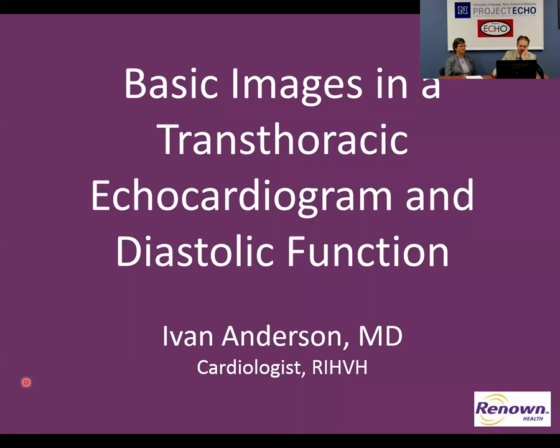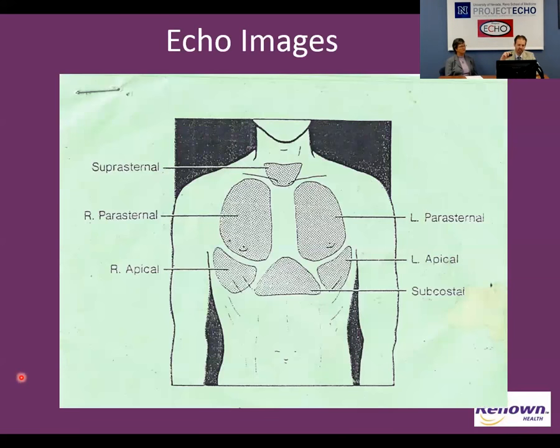This is just some basics about transthoracic echocardiogram, including images, so that when you order these studies and see the feedback, you can understand a little bit about what we see and what we can't see. So this is what I carried around as a fellow.